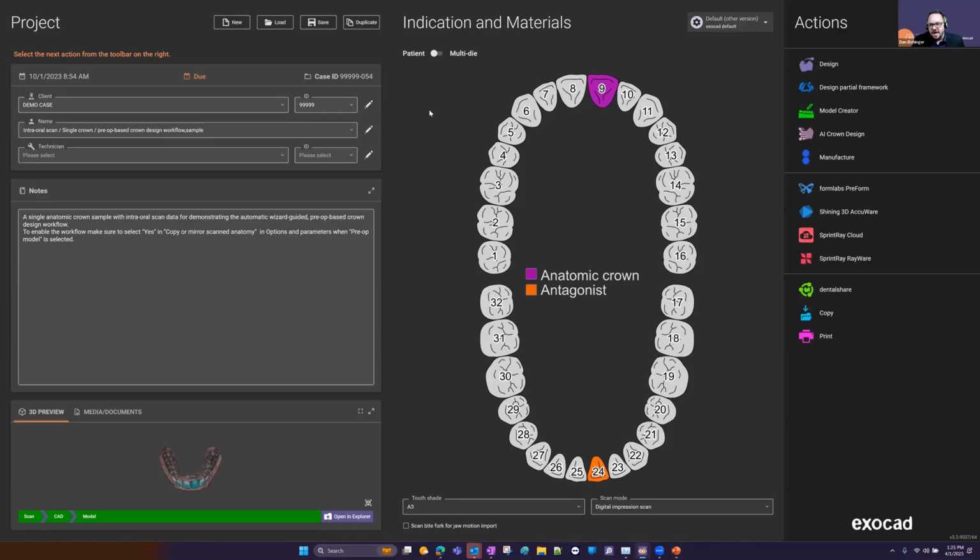And the benefit for that is when you're configuring a case, you can change default parameters for each client or customer. We all have dentists that prefer, we'll say, maybe more passive contacts, or some that want tall, broad contacts, heavy pressure. So you can really customize that by customer to make sure you're meeting those preferences.